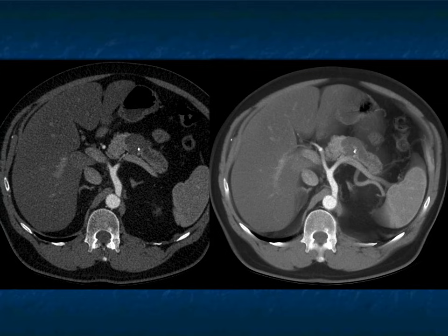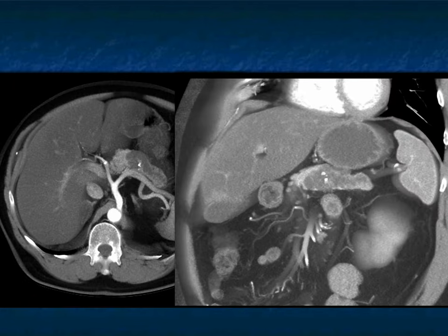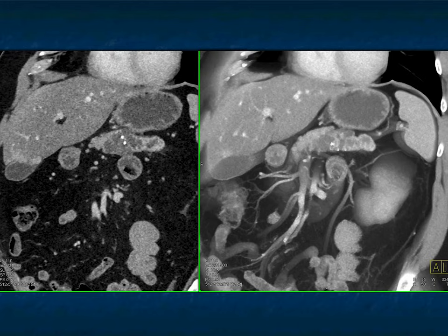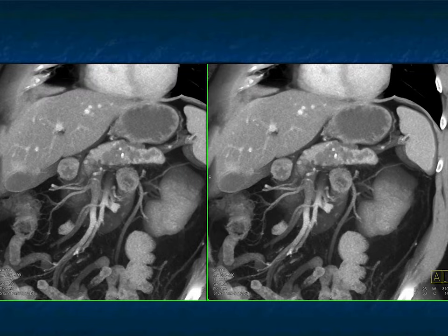What else causes pancreatic duct dilatation? Theoretically, a mucinous cystic neoplasm or MCN, or even a serous tumor, they commonly will have calcification. Here's the lesion again on a few additional 3D images. So I'm focusing on the calcifications, maybe serous cystadenoma. Neuroendocrine tumors can calcify, but this is really low density. I just can't think about this being a neuroendocrine tumor.